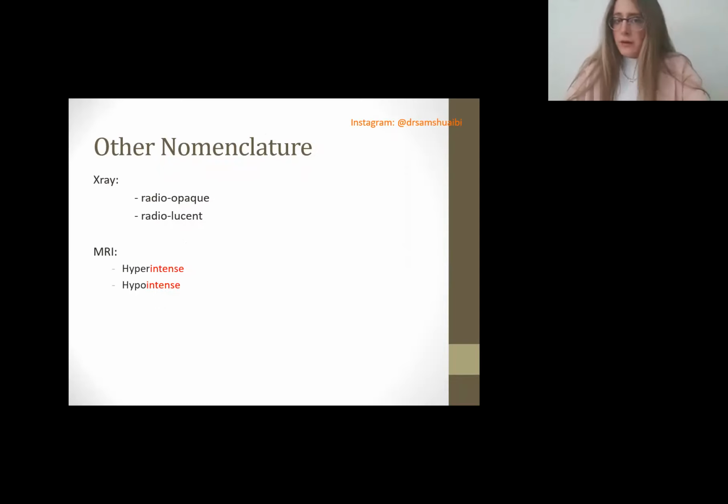So other namings, don't forget, whenever you want to explain, for example, pleural effusion in an X-ray, let's say there's a radio-opaque lesion occupying the left lower lung with obliteration of the costophrenic angle. This is the most perfect pleural effusion description. I said radio-opaque. Radiolucent, for example, when you have emphysema, increased lucency, right? Because hyperinflated chest, more air. So radiolucent, radio-opaque. That's how it goes.